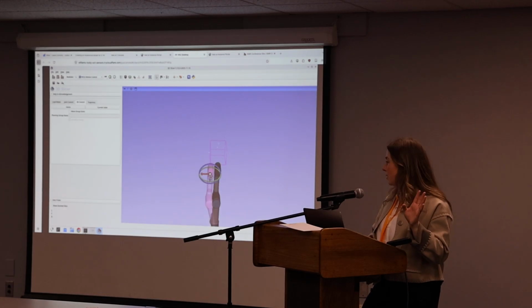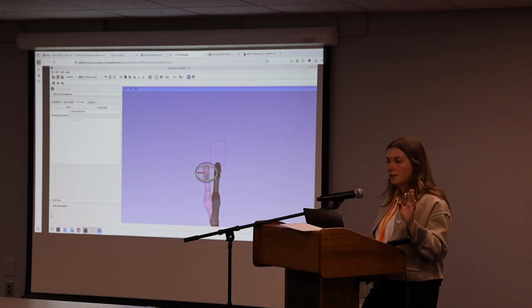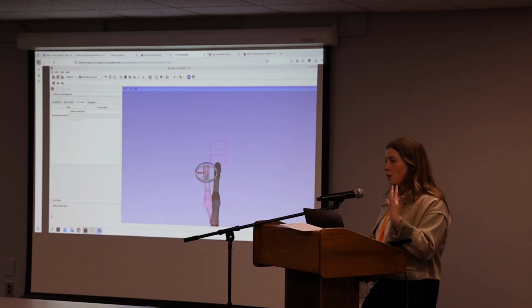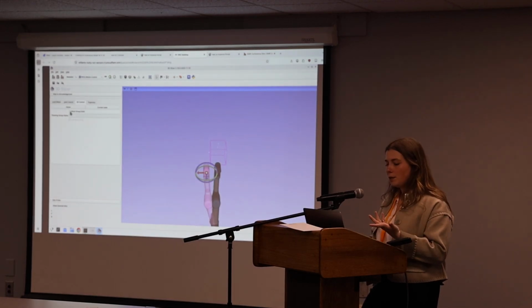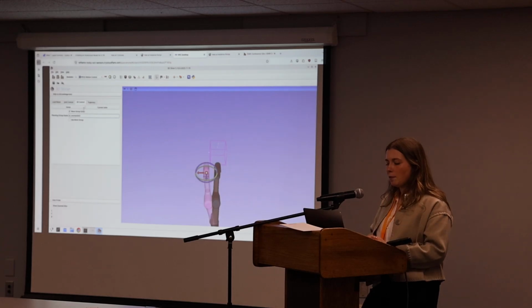So if you don't select Move Group Exists, the default is that it's just using the built-in inverse kinematics library in KDL. So if you don't have a MoveIt package for your robot, you could already use this much. But if you do and you want to do actual trajectory planning, you select Move Group Exists and then type in UR Manipulator. This is just the name of your planning group. And then use Move Group. Now that inverse kinematics is coming from the planner that you selected in MoveIt.